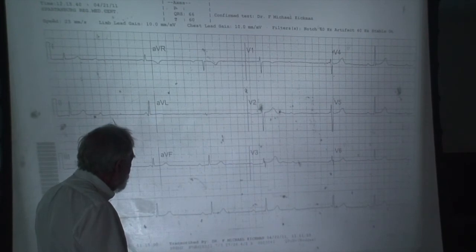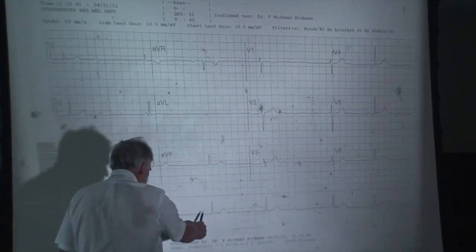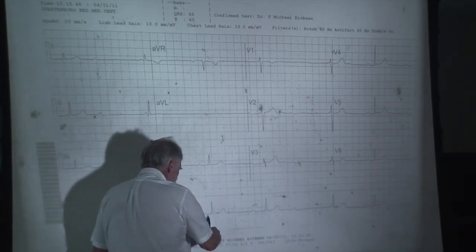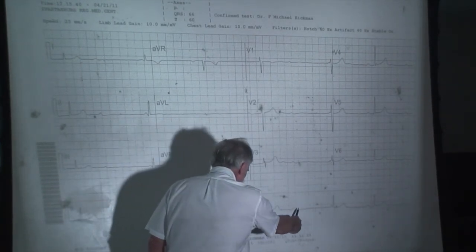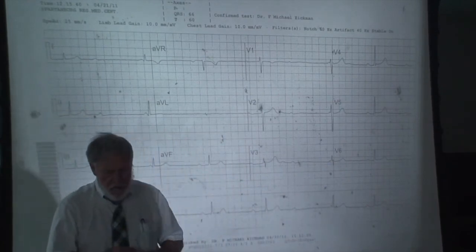Everybody see that? With Wenckebach, you have an expanding PR interval until eventually you drop it completely and start over again.